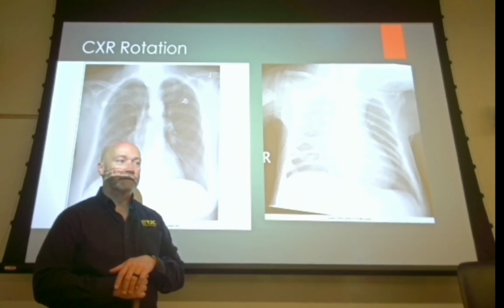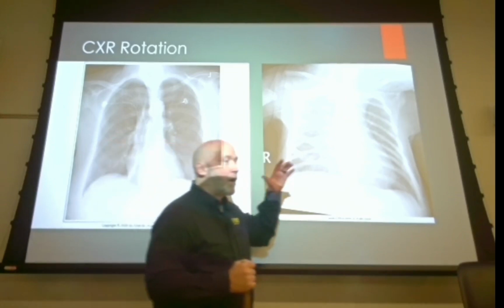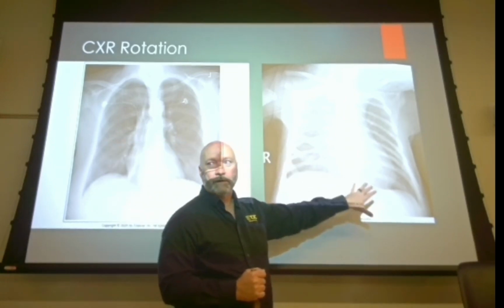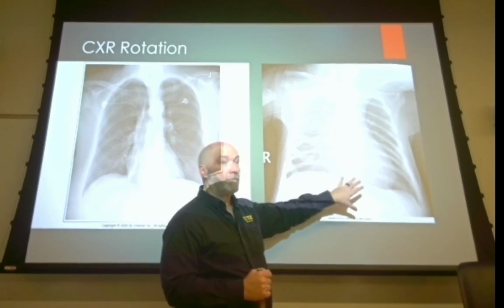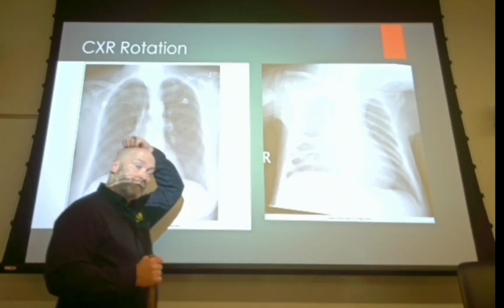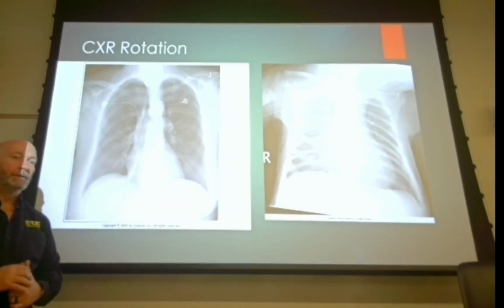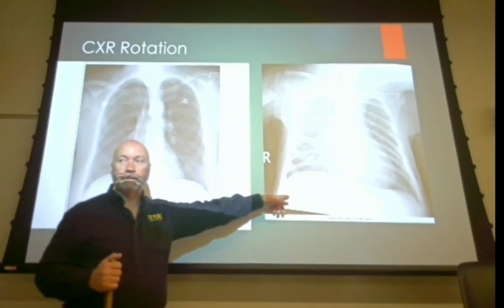thymus. So, very important, probably the hardest chest x-ray to get without any kind of rotation, probably the most important one. Shoot it AP, you're going to get a better result. Use a Pigg-O-Stat if you have to. You're going to get a better result than this in a Pigg-O-Stat.